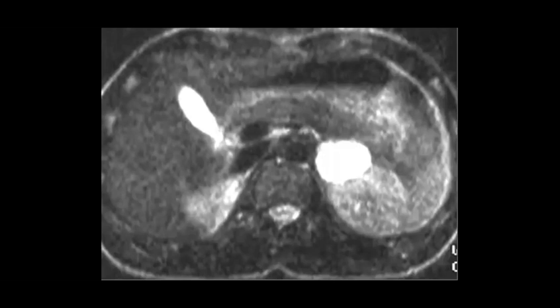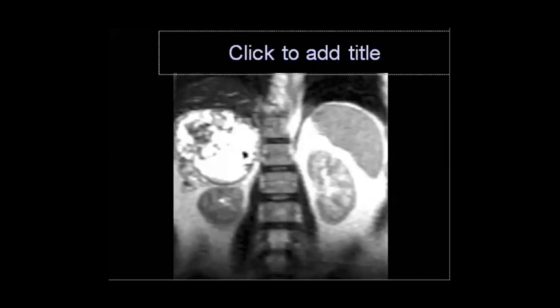Yeah. Perfect, Sarah. Nice. Perfect. And they like to show you something in nuclear uptake. Then finally, again, it can be very high. So this is the pheochromocytoma. Yes.